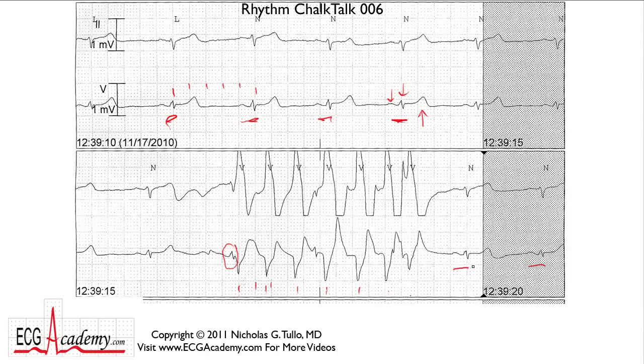But the first thing that bothers me is, if this is a QRS complex, and it looks like it, because it looks a lot like this one, and it occurs on time, how can a PVC start so soon after the QRS? In fact, it almost seems to start with the QRS complex, right? On the top lead here, that doesn't make sense. And then if you look through this tracing, you see something. In fact, you see this signal that looks just like this. So you start to wonder, is this real or not?